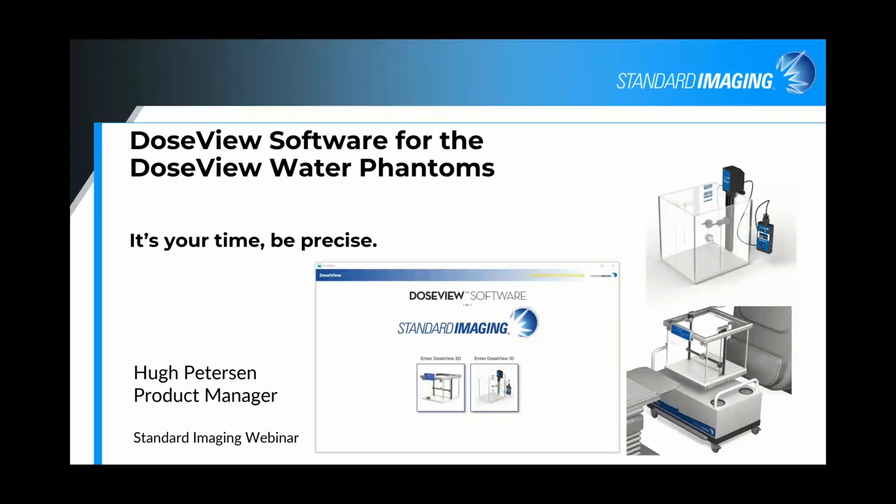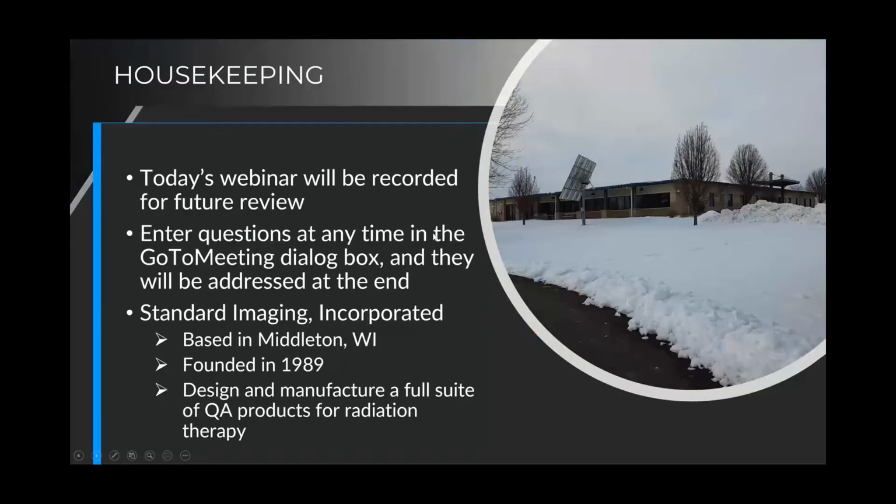I want to give you a brief overview on our DoseView software that we have for our 1D and 3D water phantoms. We like to say here, it's your time, be precise. So we want to make things as easy and barrier free as possible for your use of our QA equipment. I think we've done pretty well with our DoseView software. We're getting very good reviews from the field on it. So without further ado, let's move forward, and I'll give you an overview of the software.